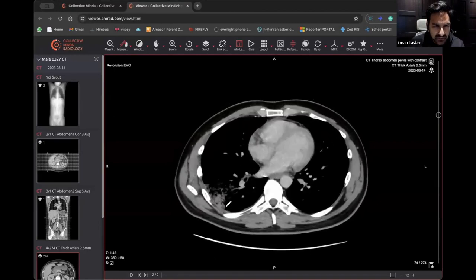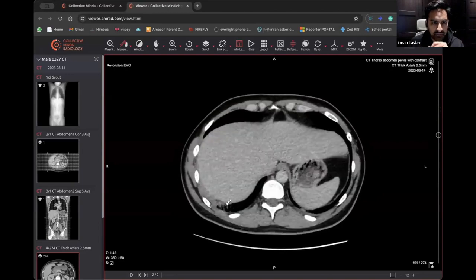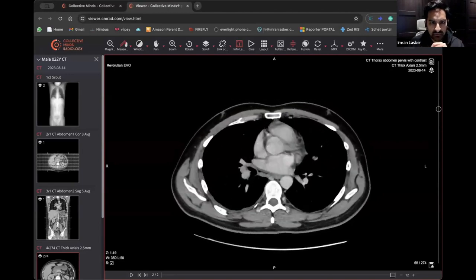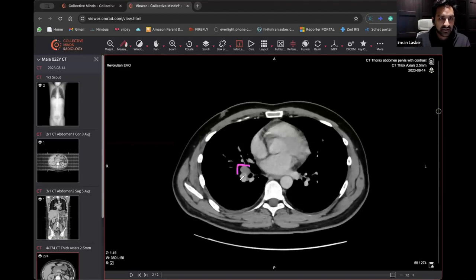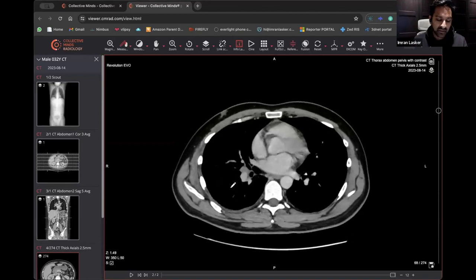And actually, there might be a small pleural effusion here, maybe very, very small, around the back there. Let's see, maybe not. But look, that's the thing. People are talking about PEs, right? So can infection cause a PE? It could. Can PE cause an infection? Not really, but you can get consolidation as a result of infarction. But when you've got lymphadenopathy, yeah, the person said, you're right, that one there, hilar lymphadenopathy. When you've got lymphadenopathy, then you would actually go for this being infection.